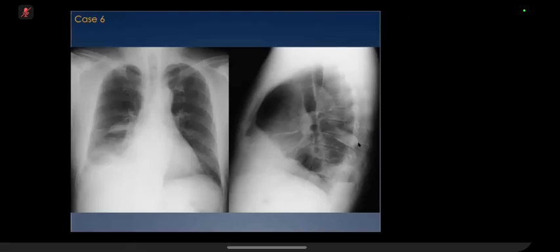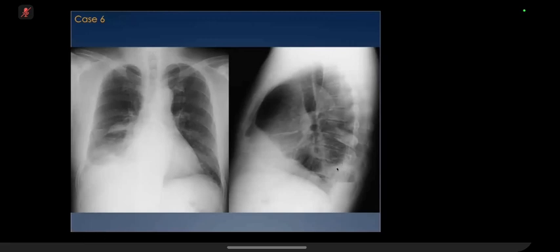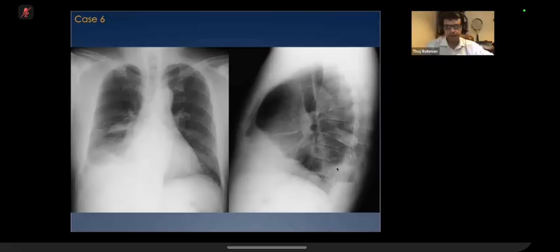Yes, which is an encysted pleural effusion in the fissure, in the right major fissure. Then there is right lower lung consolidation, and there is an air fluid level. So if you put everything together, it's probably a lung abscess. Or maybe empyema.